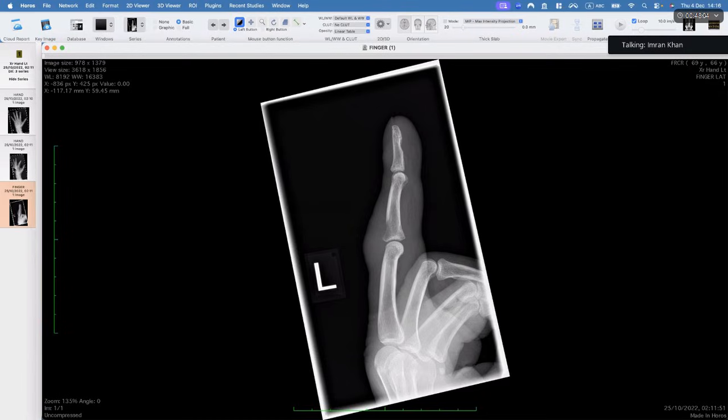So here's my question to you. First question that I want to ask you. Do you think something is happening in the bone, or something is happening outside the bone, or something may be happening in the bone that's extending outside the bone? Yes, sir. For the first question, I was thinking about a long-standing cause because I can see that a uniform kind of concavity is seen along the posterior aspect of the bone.